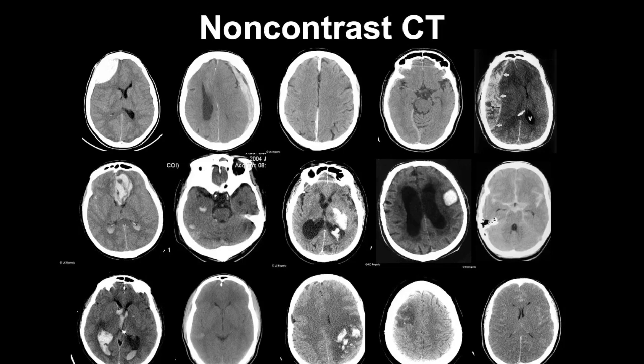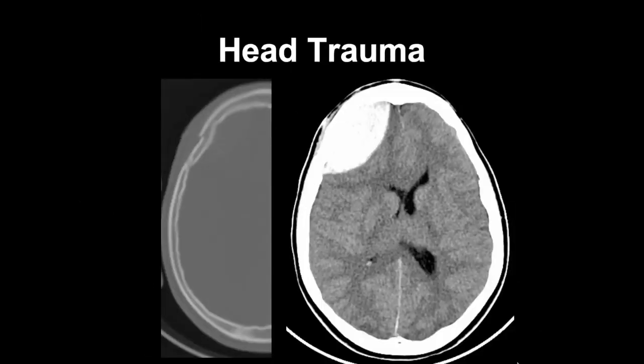We're going to see that with a little bit of clinical history combined with the appearance and the distribution of the intracranial hemorrhage, it's usually possible to assign a relatively specific cause to the intracranial hemorrhage, and that's the exercise that we're going to go through. We're going to start with the most common intracranial hemorrhages and work our way through to the less common ones.